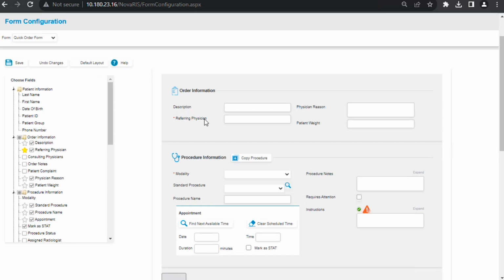One of the things that you also have to be sure of is there will be no exceptions to the required information. So in this case, for any patient, it doesn't matter where they come from, you will have to input the referring physician, right? So if you are a hospital that has walk-in patients and also inpatients, most likely you will still have to put as referring physician sometimes your own staff if they come from inpatient, or if they are walk-ins, most likely they will have to provide you with that. So when you are requiring, that is one of the things that you have to understand. If you have inpatients and you don't want to input those because you know everything that comes in from my own staff, I really don't have to type it every time.